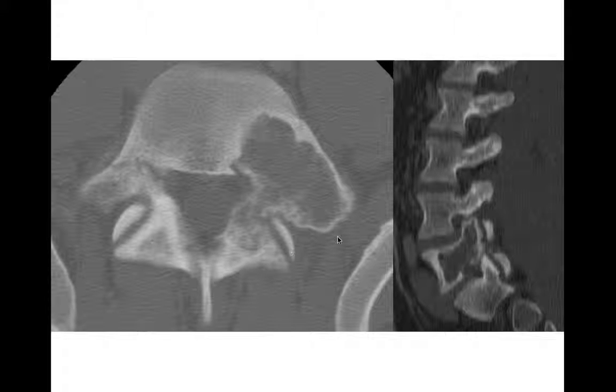This was another aneurysmal bone cyst of the spine, the lumbar spine, and this geographic lytic lesion extending into the posterior elements. Here we see it involving the vertebral body and going into the posterior elements. ABC, giant cell tumors can occur in the spine too, and so that would be a good thought in this case. Osteoblastoma would be another good thought as well here. We don't see any matrix, but still possible.